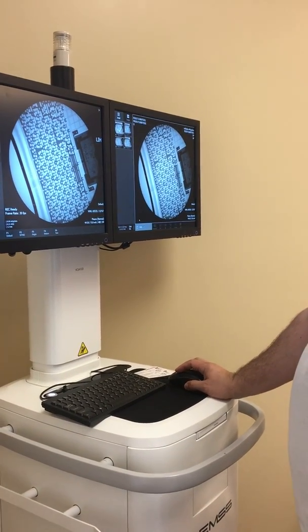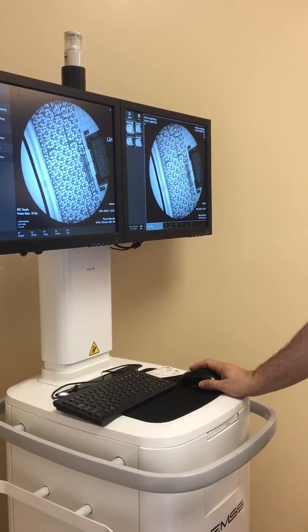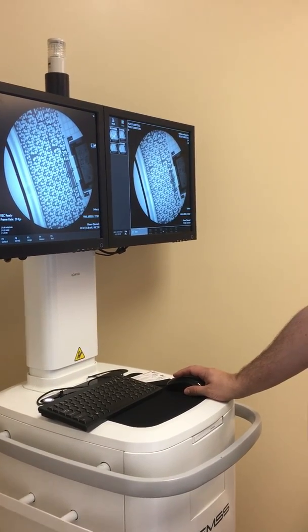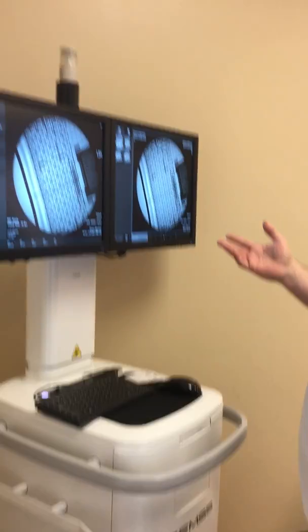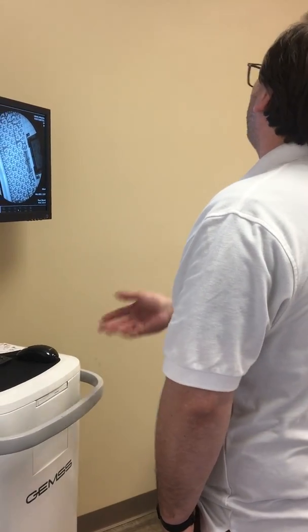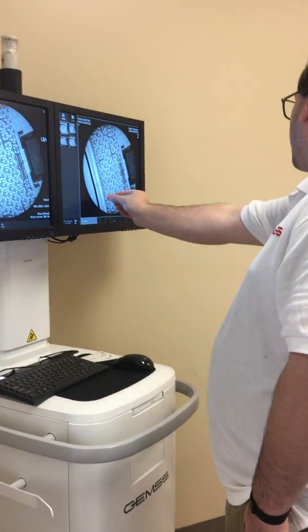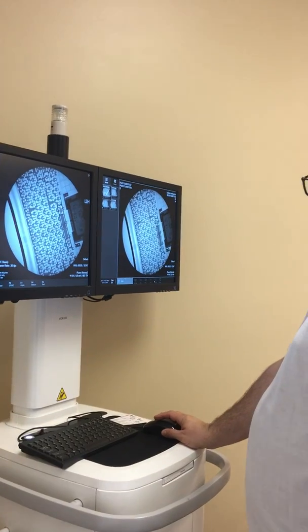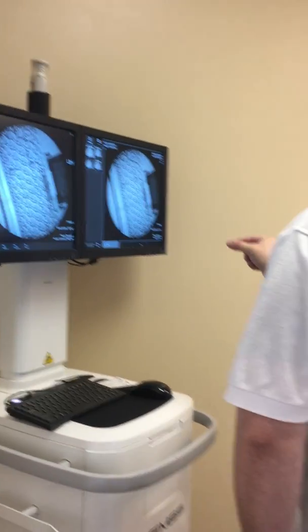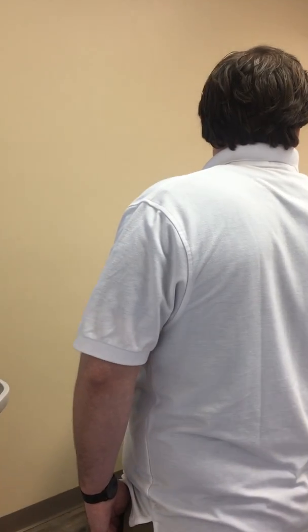Okay. Cine loop. So if you have a Cine loop up here, you can play it. You can stop it. If you have a long Cine loop, like a DSA run, and you don't need all of it, say it's 20 seconds long and all we're really interested in is this 3-second clip in the middle, we can cut a segment out of it, or we can capture one image out of it, save that, and throw the rest in the trash because it's just a waste of space.